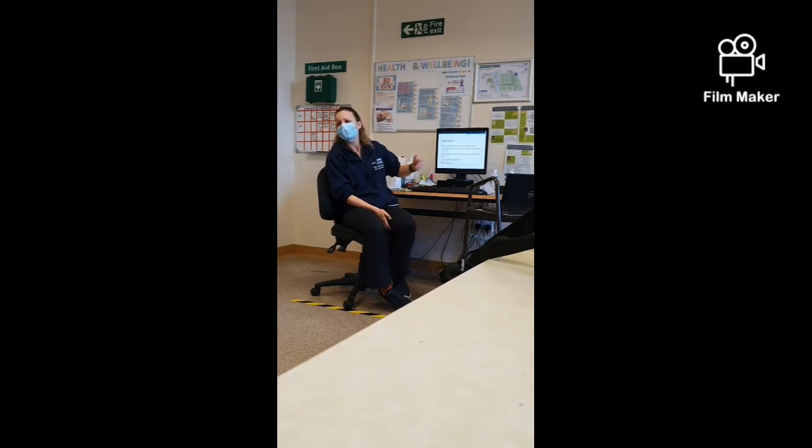P, projection. Has it been done AP or PA? So a lot of the patients on the wards will be done AP because they'll be sat or laid in bed, and so they'll be done anterior to posterior. If you're coming in as an outpatient and you're having a chest X-ray done like that, then they're quite mobile, and they'll be able to do the chest X-ray posterior to anterior.